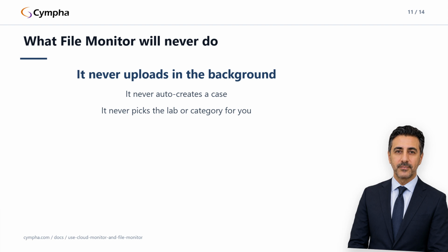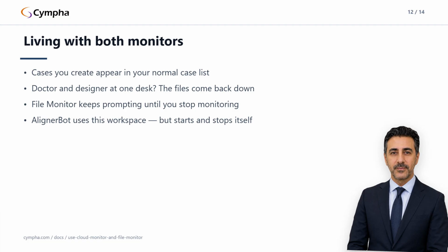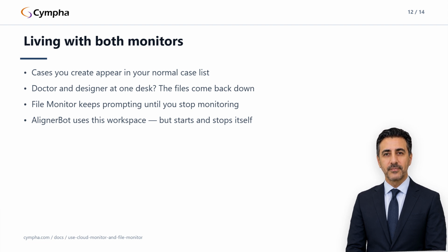A few things about living with these two running side by side. Cloud Monitor keeps polling in the background, so cases you submit through the Create a Case flow show up in your normal case list like any other. And here's a pleasing consequence if you're both a doctor and a designer on the same workstation. The case you just created from a scanner file goes up, and then, as soon as a designer takes it, which might well be you, the agent re-downloads the case files into your Cloud Monitor workspace. The two monitors coexist happily. The file makes a round trip through Cympha and comes back organized as a proper case folder.